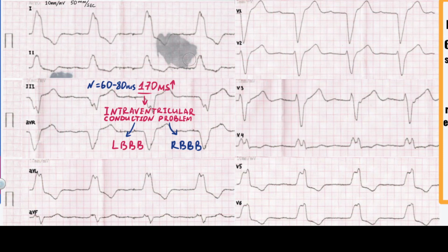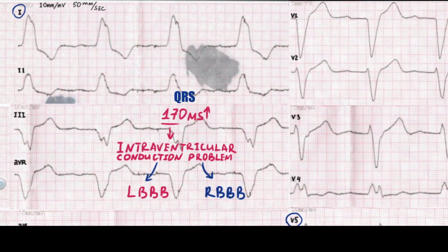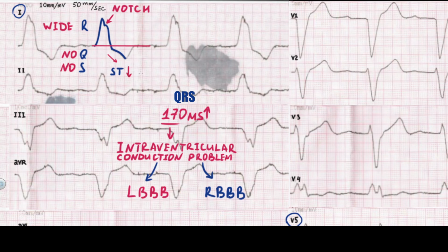To distinguish one from another, we need to check QRS, ST and T in left and right leads. Left leads are the first standard lead and V5, V6. QRS in all of the left leads is similar; we described the first standard lead. QRS here is represented by a wide R wave with a notched peak. There is no Q wave and no S wave. Also in this lead we see descending ST segment depression with up-oriented convexity, which continues to a negative asymmetric T wave.